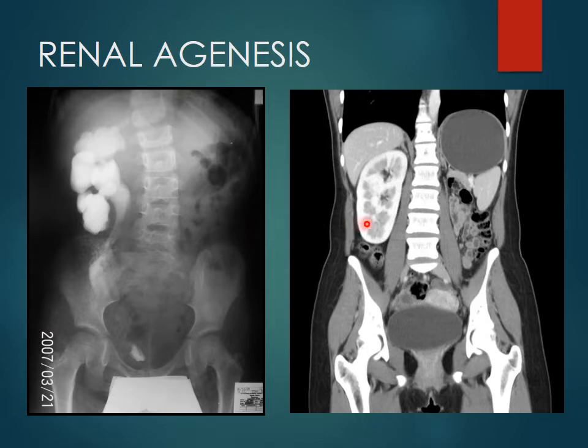CT scan of the same patient confirmed the findings seen in IVP wherein there's only the right kidney with absence of the left kidney.